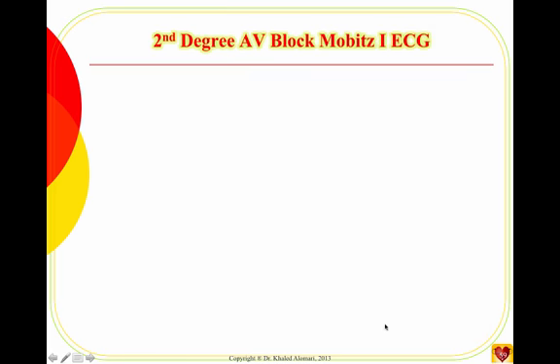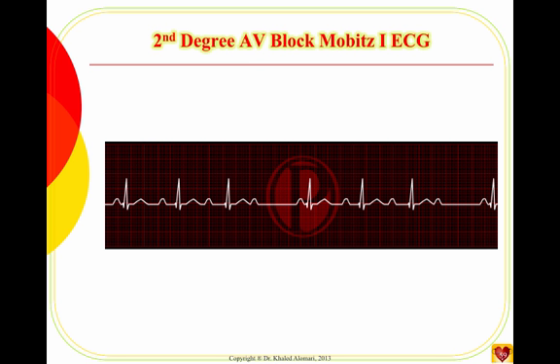So, what is second degree on ECG? Let me tell you something. If you find the PR keeps getting longer, then that's it.